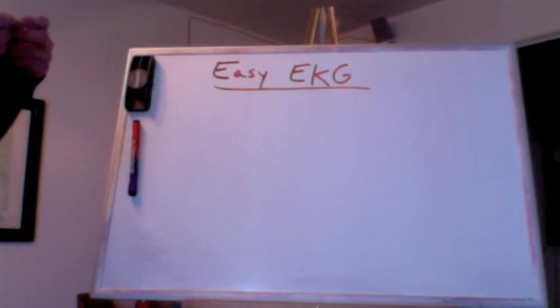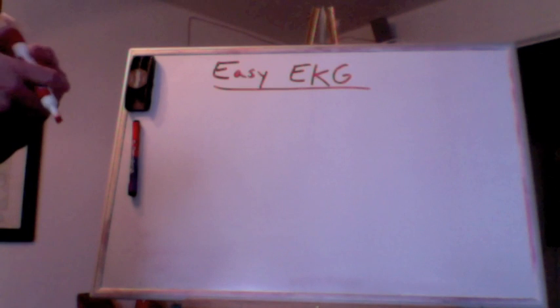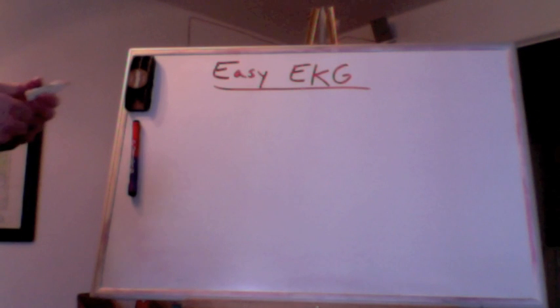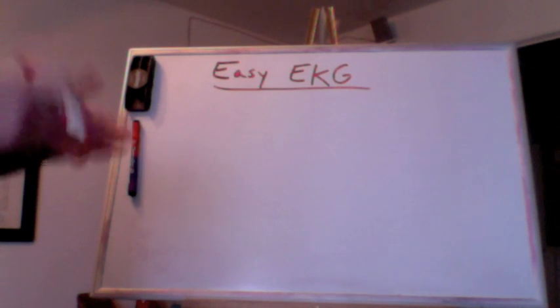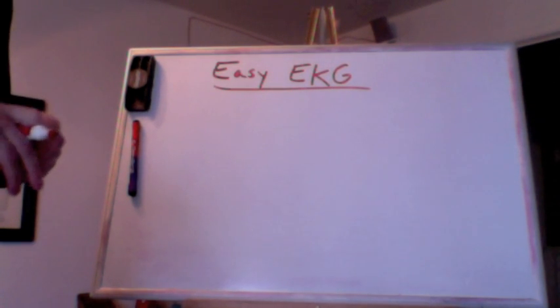Alright, hey guys, so today I'm going to be going over a quick video on how to interpret a 6-lead EKG or ECG or however you want to say it. They're both the same thing. So I know it's kind of tricky if you've never seen it before, and there's a couple tips and tricks that I use that makes it real easy to understand it and to give you a quick interpretation of what's going on with your patient.